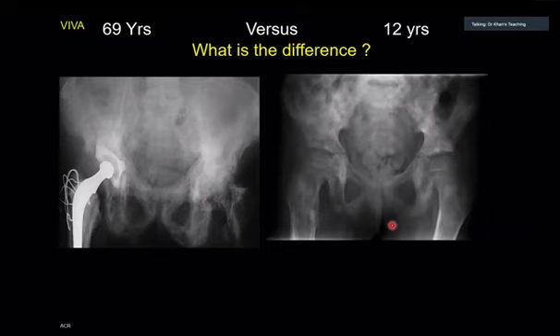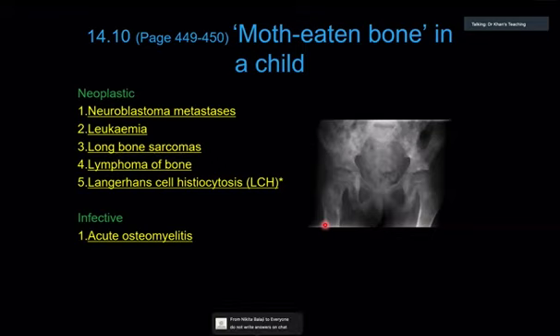Whole of the skeleton is abnormal. Hint is that there is a differential in Chapman. There is a word. Is it bone within bone appearance increased? No, if you see, whole of this skeleton is abnormal, right? Now, the point is, this is known as moth-eaten bone. There is nothing which is normal.